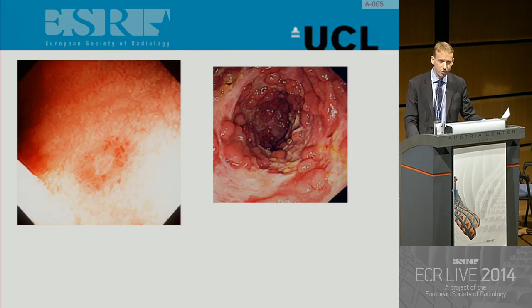And of course, we have to remember that the colon is very easily accessible to the endoscopist, so we've got a very good test that's probably not in our hands as radiologists, and that's the endoscope. These are just typical pictures. They can see the mucosal lining, they can see very subtle things, and I'll show you an example of how we can't see things as subtle as an aphthous ulcer. They can also see advanced things, and perhaps that's where we can compete with them, because our technologies can get very good images of these more advanced stages.